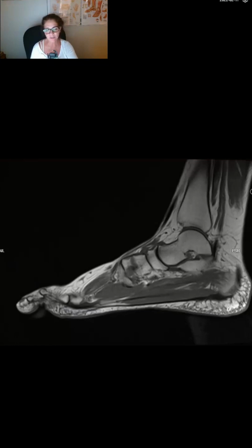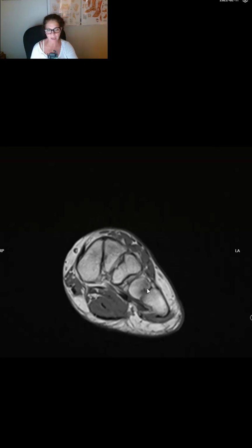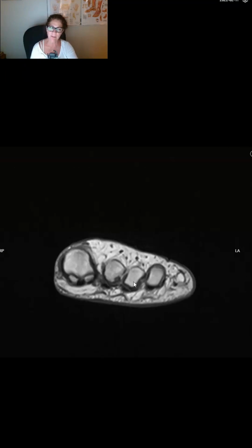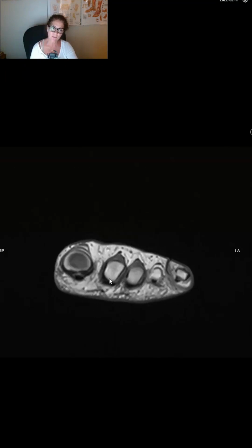Let's just take a look at the forefoot and understand that this patient, if they're coming in on their outer side of their foot in a supinated mechanic, they have to get all the way over to the great toe in order to toe off. So we're looking at the forefoot parabola to understand at what phase of the biomechanic are they in. So what I'm seeing here is a subtle reversal of the forefoot parabola.